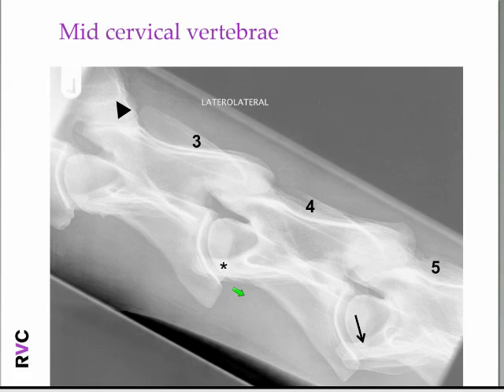Now, very commonly, in my experience anyway, what you find is that in the middle of your radiograph, you get a nice lateral projection, but towards the periphery, you tend to lose that, which is what's shown as this arrow here. And what you can see is that we've got one ventrolateral process on one side here, but it's not overlying the other one on this side here. And that tells me that actually, towards the periphery of this radiograph, we haven't got a perfect lateral.